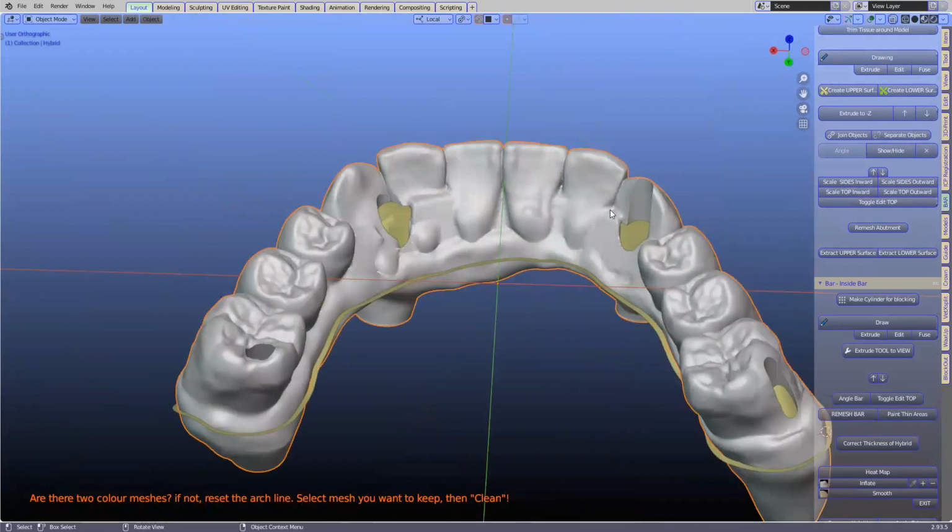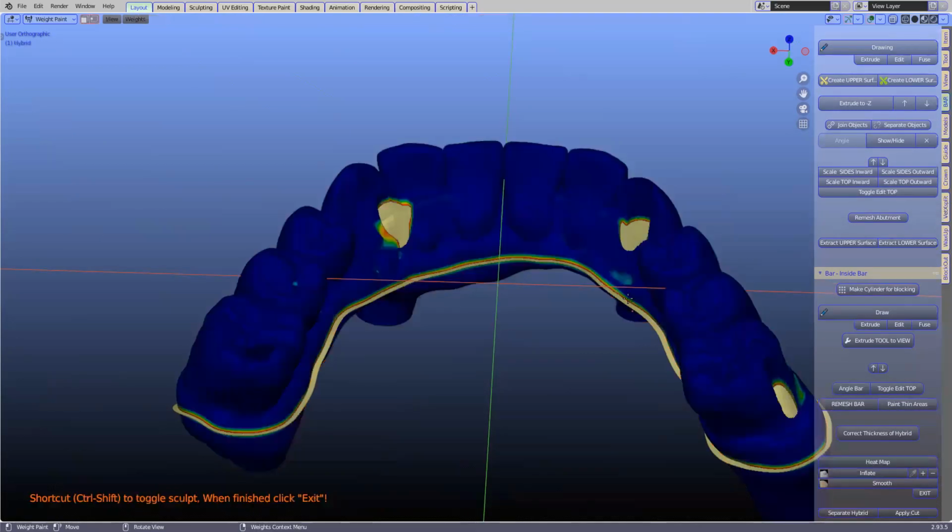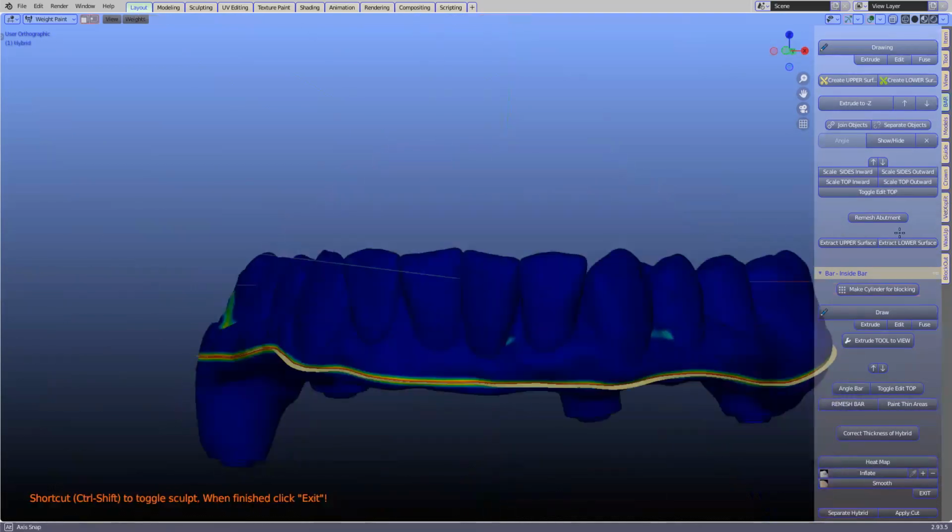Yes, they actually cut away these little blobs. Okay, I get you. So the blobs, these cutting cylinders, are used to protect the inside layer. All right, so let us look at the heat map. Okay, so that's looking very, very healthy to me.